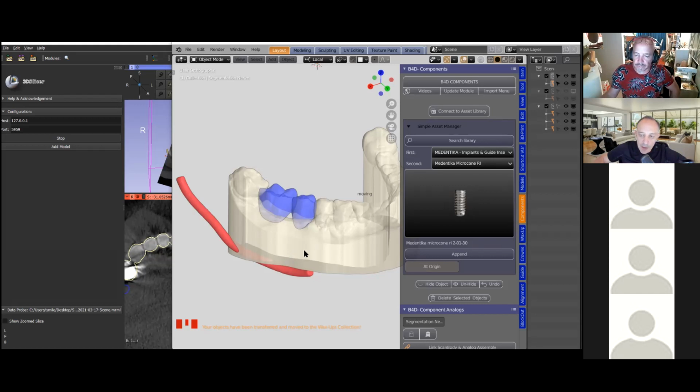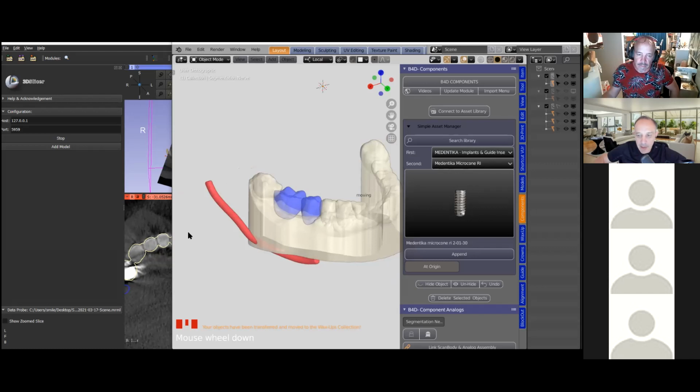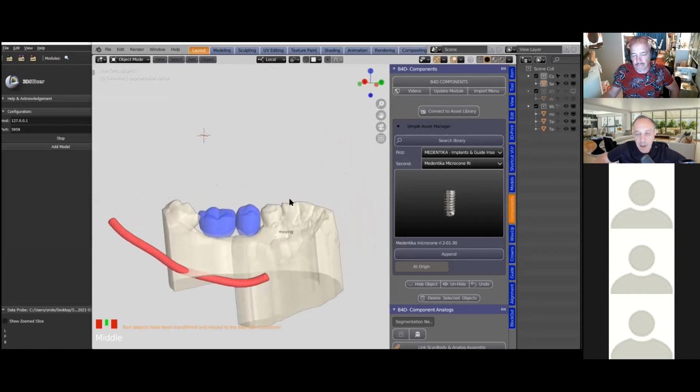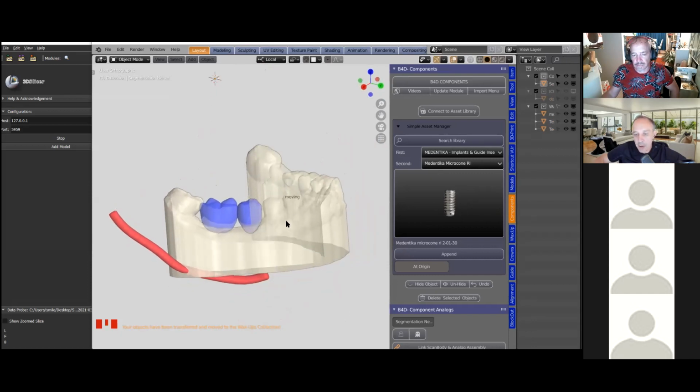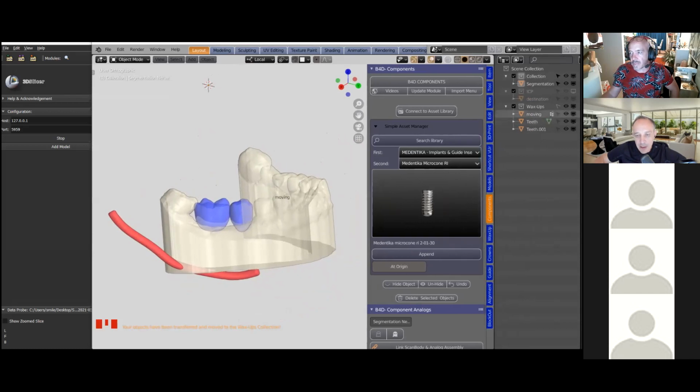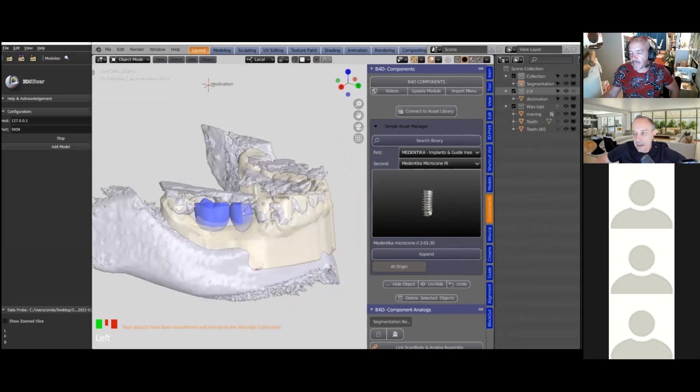Now with a lot of the implants, I have pre-assembled those into assemblies. So you'll find that the scan body and the analog are linked in an assembly. The abutment and the connection geometry that will make the crown will also be in an assembly. In this way, we can shortcut all this. A lot of time is saved by having it all together already in pre-assembled parts.